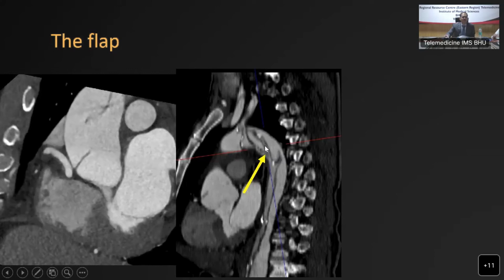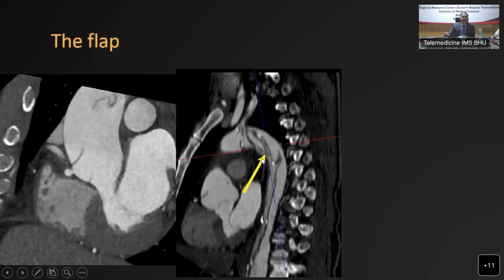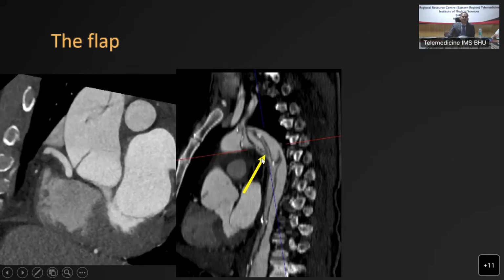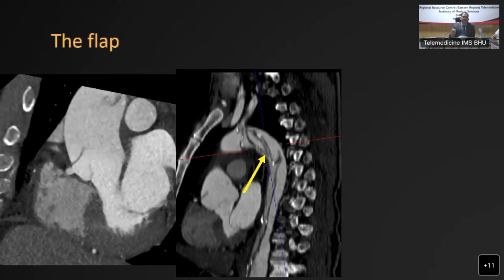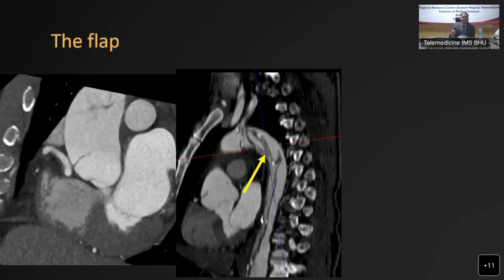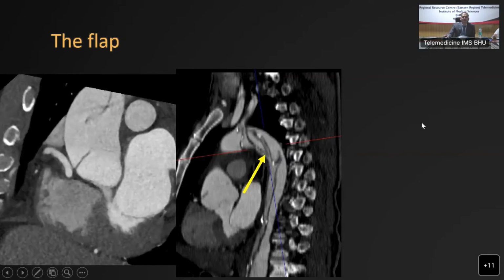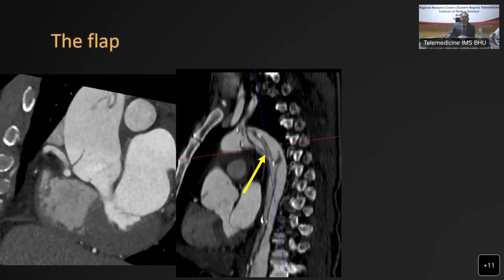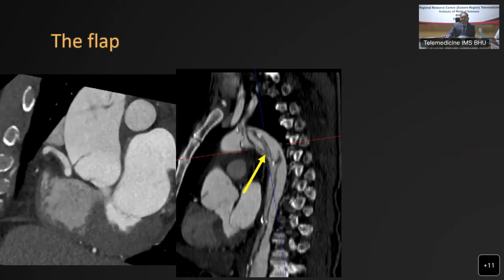This is another finding that we see very uncommonly. This is the intimal flap, and it is so redundant and so loose that it has telescoped upon itself, causing what is called intimo-intimal intussusception. Intimo-intimal intussusception is an important finding because patients who have this intussusception tend to spend a longer time in the OR than patients who do not have this finding.